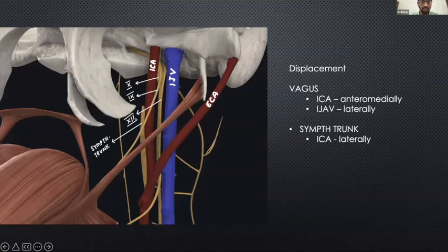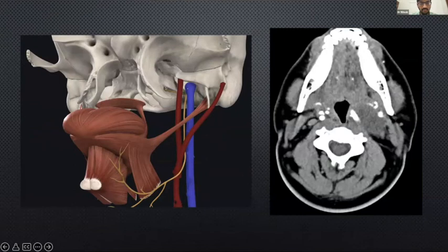And another thing, you can see here this will be the hypoglossal canal. This is the hypoglossal nerve reaching till the tongue. This also shows a course almost anterior to the IJV, and it is at the suprahyoid level, above the CCA, showing in between the ECA and ICA.